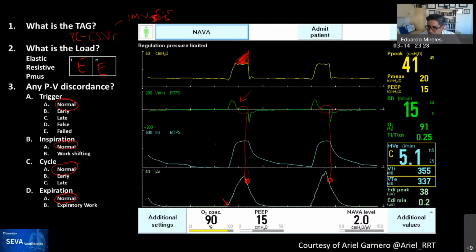Rob, comments? So you're saying, following the flow, that's why we see that issue right there, because the diaphragm can't contract anymore, and so it's kind of stopping the flow. Either the diaphragm cannot contract or the lung cannot expand anymore. You don't see any more movement, or it's very little and you cannot see it, but there it is. Go ahead, Rob. Nope, looks good.